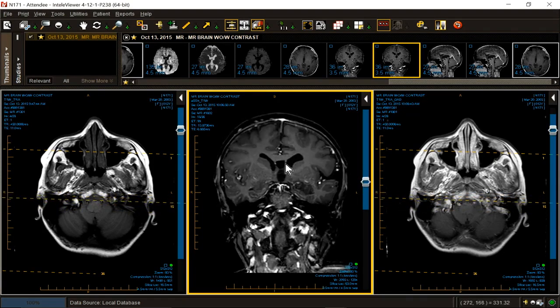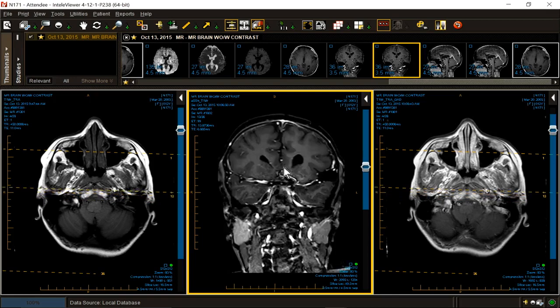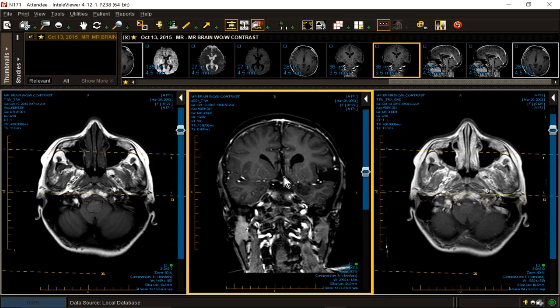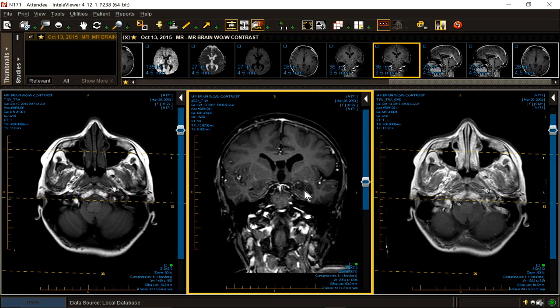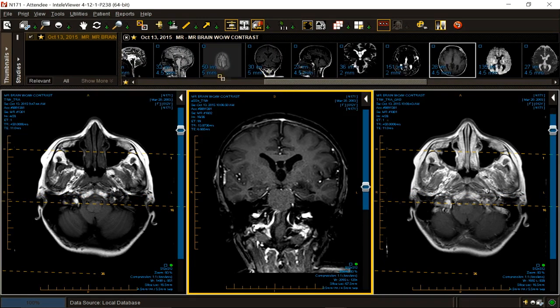There is an abnormality in the corpus callosum. There's a cyst in the midline. Probably is a midline arachnoid cyst as opposed to a simple cavum, because there is mass effect to it, but that's not why we're here. But we do have multiple anomalies in this person with a mass. So what is our differential diagnosis?